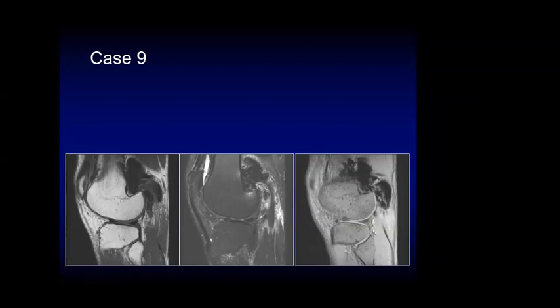So what is the characteristic pathology that would have bloom artifact? So what is the tumor, low on all the sequences, and has bloom on the gradient?